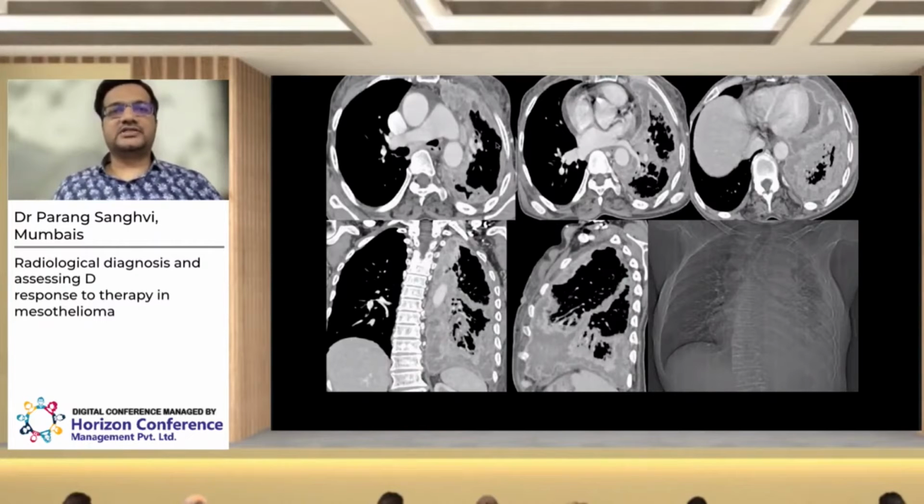So this was a typical case of a mesothelioma. You can appreciate again, there is a diffuse nodular enhancing pleural thickening that is circumferential, involving the mediastinal pleura as well. There may or may not be mediastinal invasion, and all those signs we are going to see, and specifically how the MRI is going to be helpful in that. You have some pleural effusion also, and again the coronal and sagittal reconstructions really help to pick up the fissural involvement, which is also very, very common in mesothelioma, and that's how we make the diagnosis.